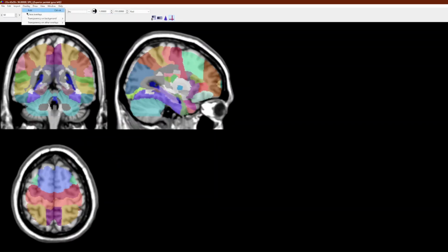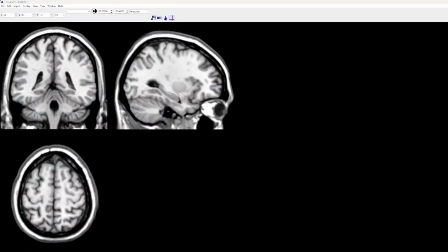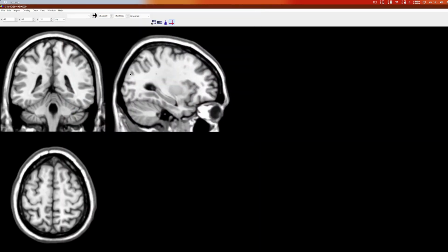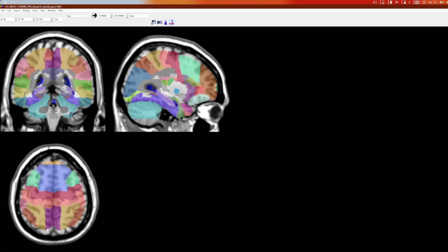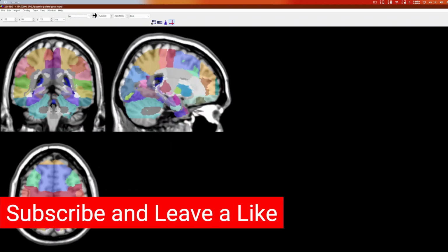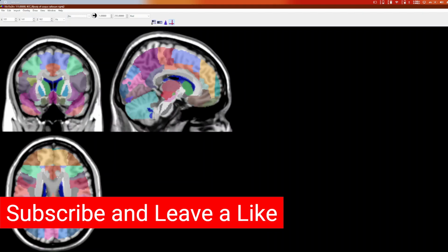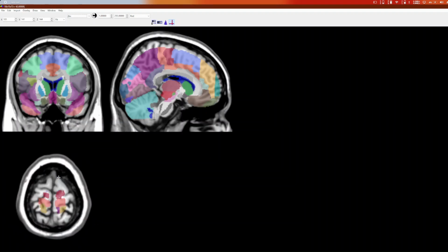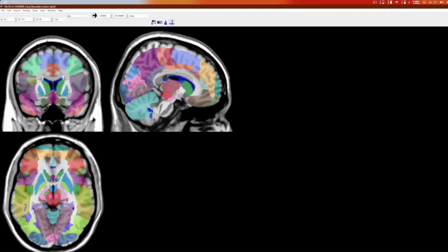You can also overlay some of these resources within the resource folder onto MRIcron as well. So I'm just going to overlay this. And it's going to show me an atlas, which basically helps me learn whether the part of the brain that maybe I'm looking at belongs to maybe the superior parietal gyrus, left, right. I can go through the brain and figure out maybe where the lesion is and other information as well. So once again, we can also input template fMRI activations as well.